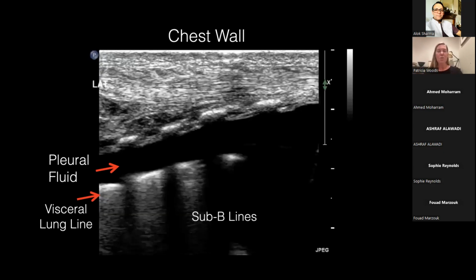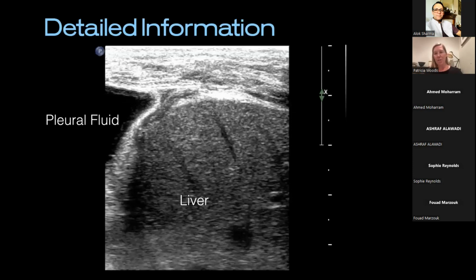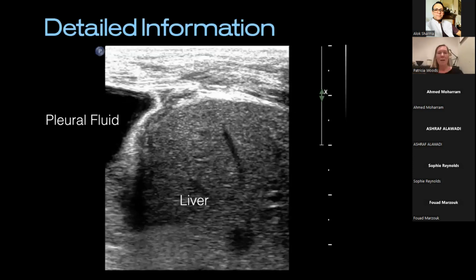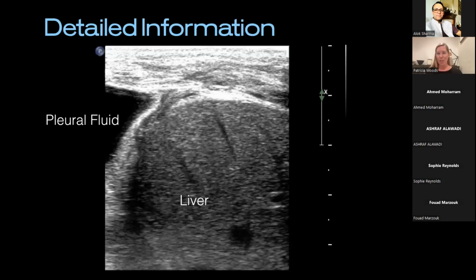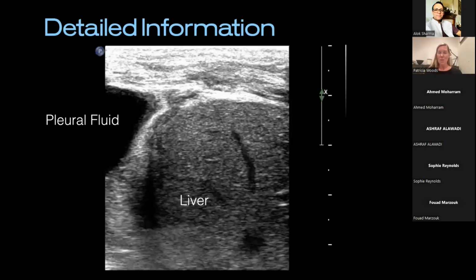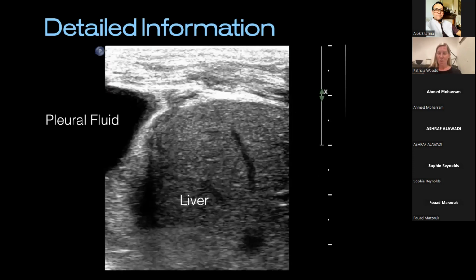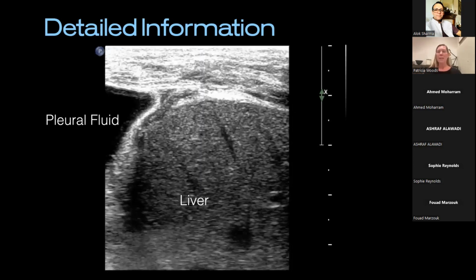It gives you beautiful contrast of organs here. Again, you can see the real difference in echogenicity of standard chest wall edema to that of an encapsulated organ, to movement of the diaphragm and the fluid, and it's crystal clear. One of the things I enjoy least with X-rays is how everything's grey and fluffy, and words are put in to describe areas where you're squinting and thinking, yeah, that's probably the liver.